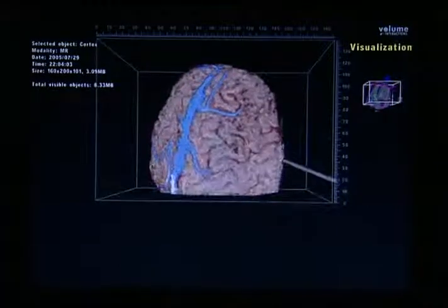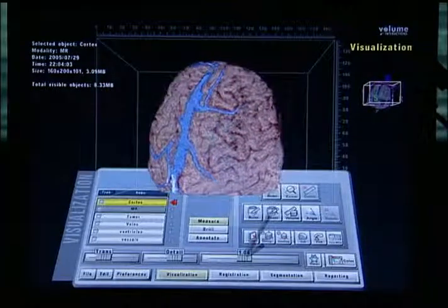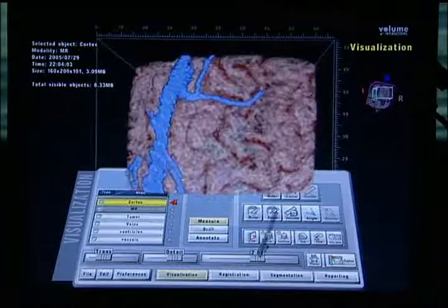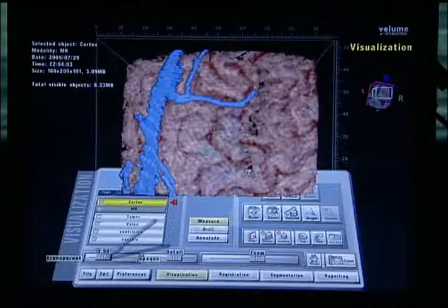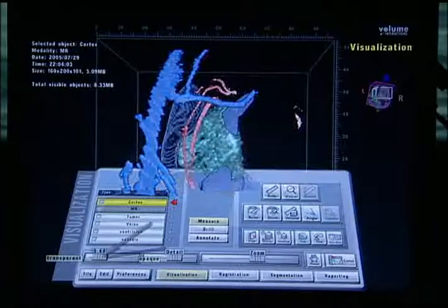So you can get an idea, if you were going to go interhemispheric transcallosal, where your veins are, the window you would want to pick in between the veins. If you're going to do transcortical, you can also get an idea of where you'd want to make your corticectomy, and build back to the surface of the case.